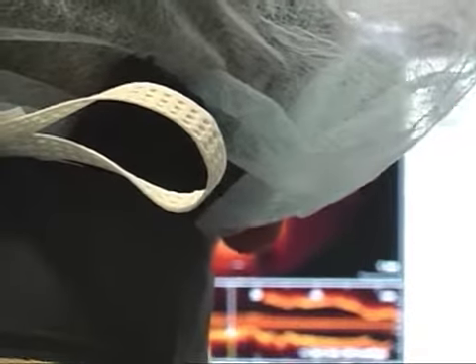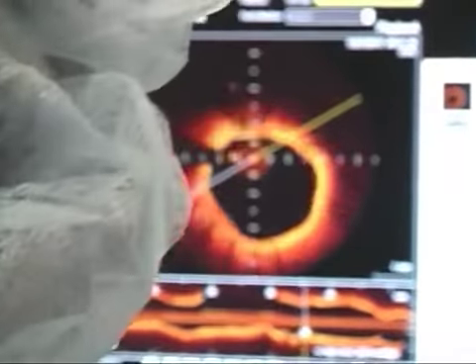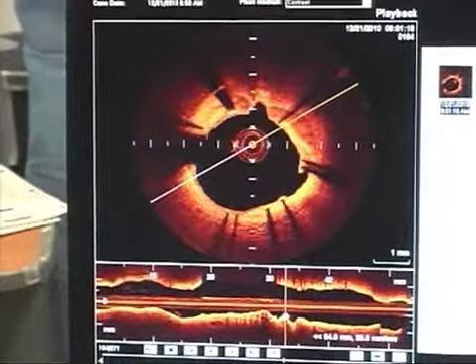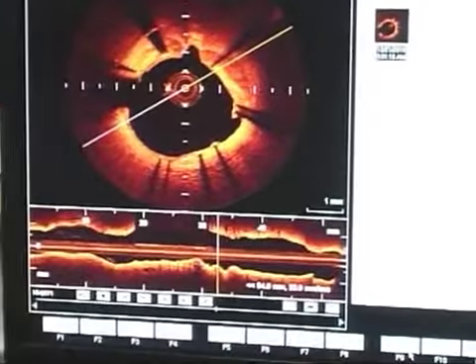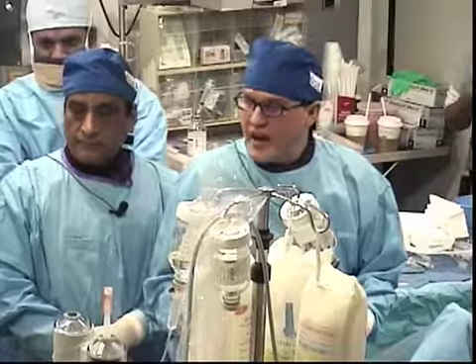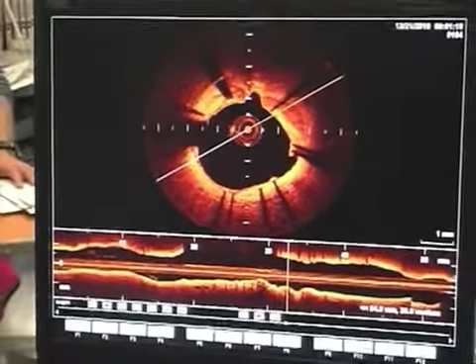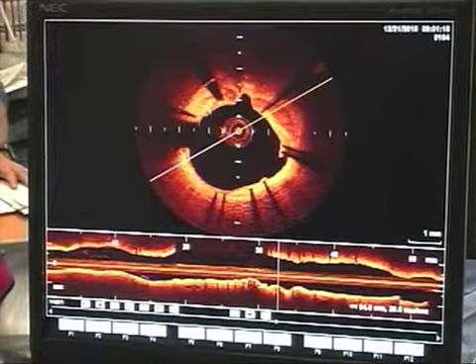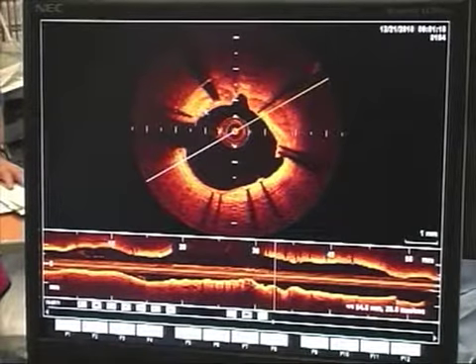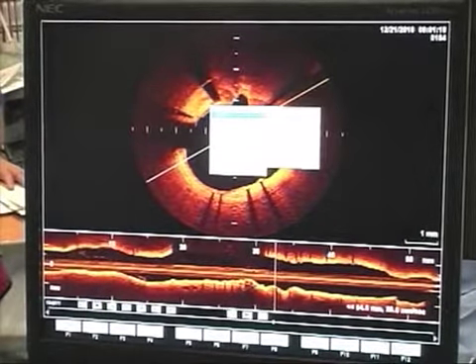We do understand. Can I stop the Plavix, clopidogrel, for a few days before the patient goes for surgery? Well, in this case, you can easily tell that there are some struts that are at the vessel lumen, almost attached to the vessel wall, but there are some that are not properly endothelialized. There are other ones like what is seen right now with the arrow that you can easily see the strut and you can see the endothelium on top of it.